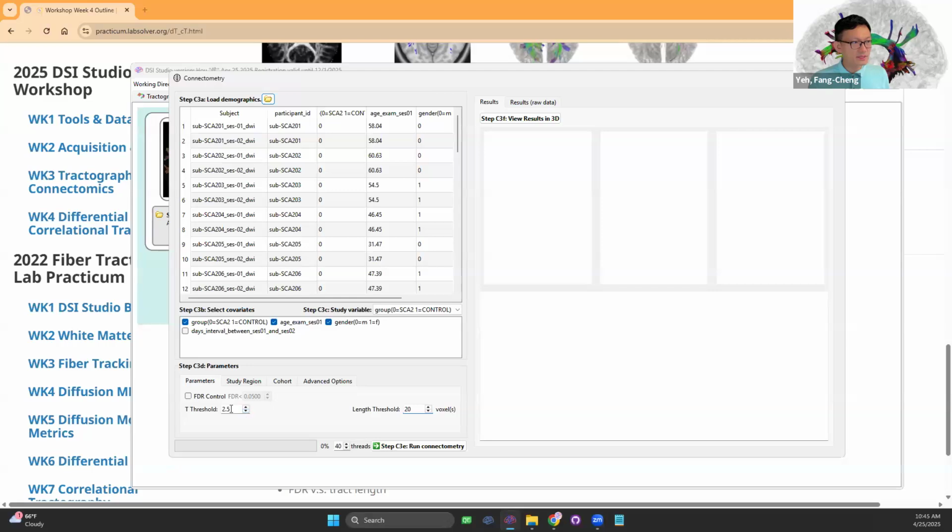You could imagine these two parameters are very similar to what we changed during differential tractography. When we compare baseline and follow-up, we change the anisotropic threshold. That's similar to what you change here. That's related to termination. Also, there's another threshold about the length constraint, and that's here. So similar paradigms, but with different names.